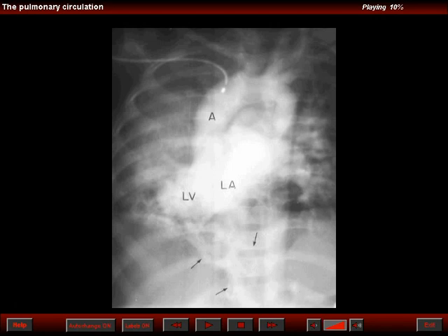Here is another angiogram which reveals the left atrium receiving left pulmonary veins, and we can see the venous phase of the segment joining the two lungs, and these veins can drain into right or left pulmonary veins, or even may drain into systemic veins.